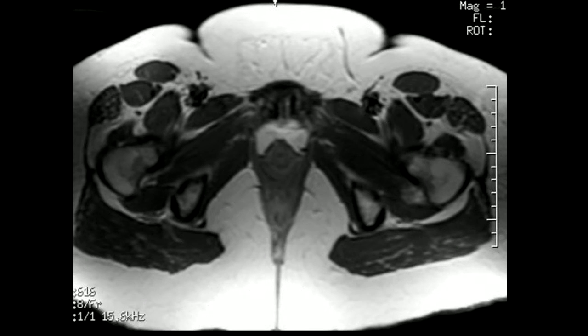For example, here was a patient who had a lesion around his hip. He had an MR done. You can see the lesion behind the hip, but it's very difficult to evaluate it in relation to the local anatomy. This was ordered as a pelvis for a hip lesion, a patient presenting with hip pain, and because it was ordered as a pelvis, it was done as a pelvis. And remember, a pelvis is generally done at a large field of view. In this case, it was 37 centimeters.